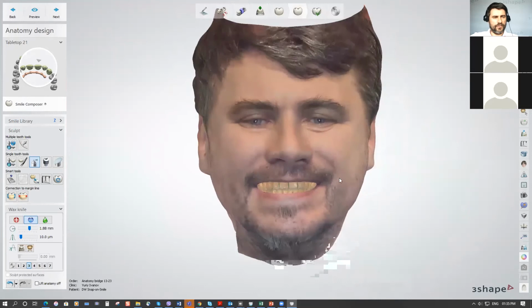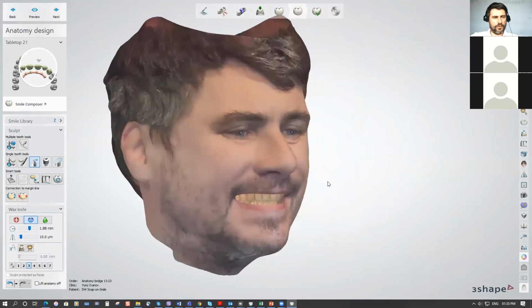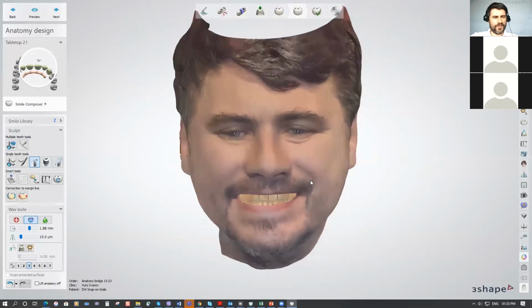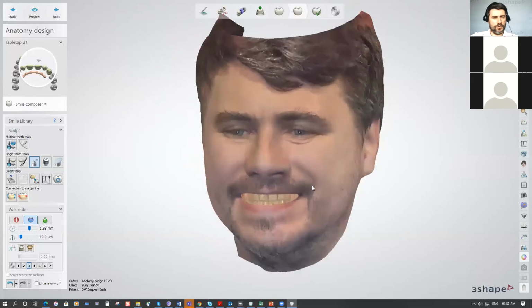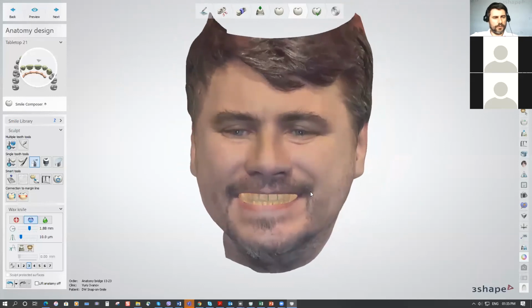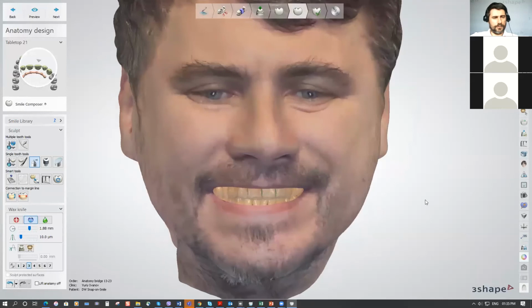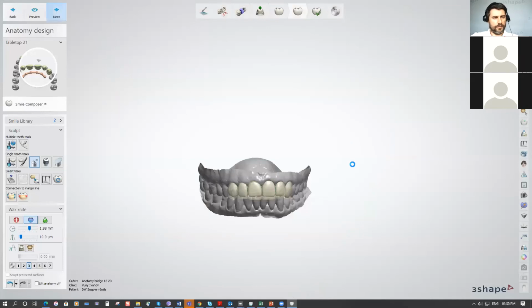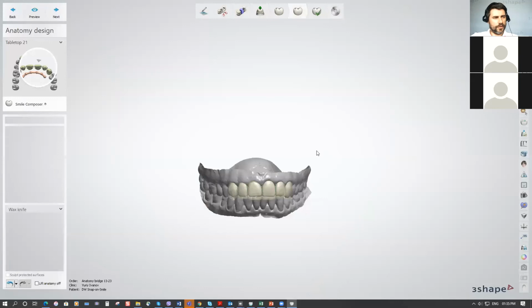And I could take a video of this face and smile with the color and send it to the patient to show how the treatment could look like. And yeah, this is one of the ways we could communicate with the patient. Okay, and after that, let's switch it off. We are ready to hit next to come to the final step.